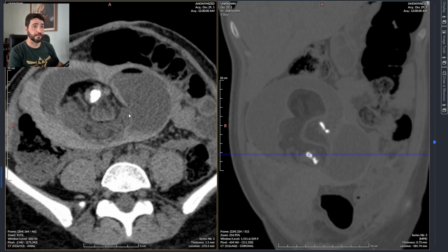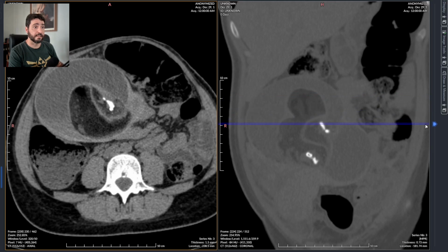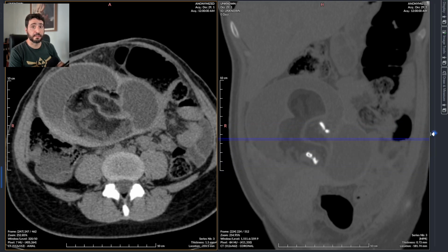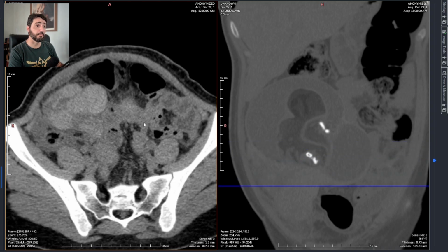And as I have described to you until now, we can readily make this diagnosis of a cystic mature teratoma because it has a classic presentation. It's a large mass with all these components I just explained to you. But knowing it is a tumor, most probably from the ovary, it still doesn't justify the acute pain the patient is complaining about. So why is she complaining about pain?